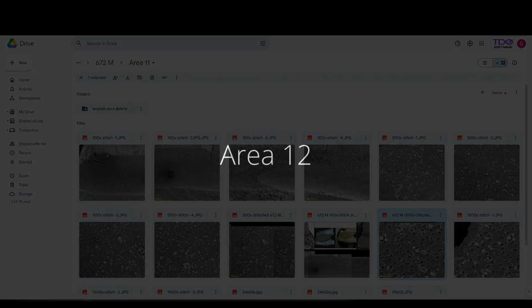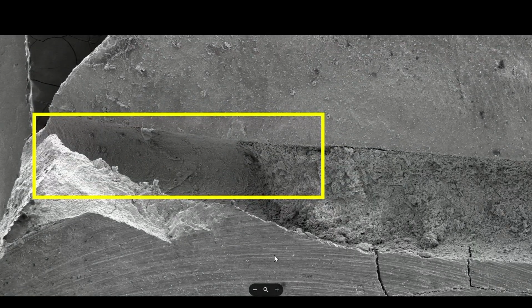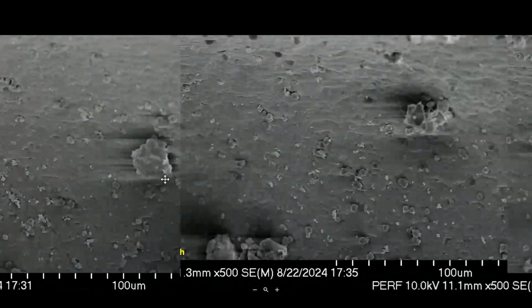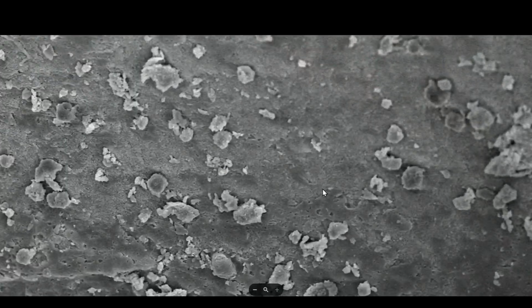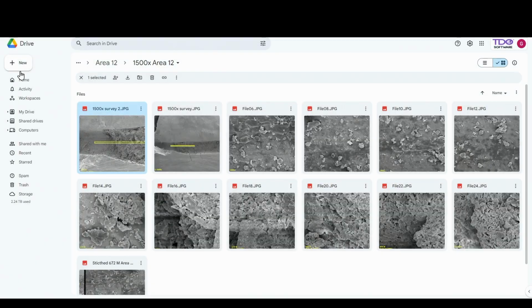If we go up in this area, or when we go to area 12, now that's the area where you can see where the sectioning disc stopped. And right where it stopped is a virgin canal, and we'll be interested in looking at what that dentin looks like. And then where it entered the canal, I want you to have a sense of what that debris actually looks like under the SEM.